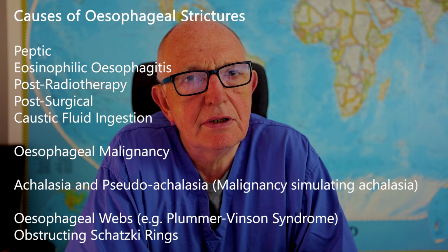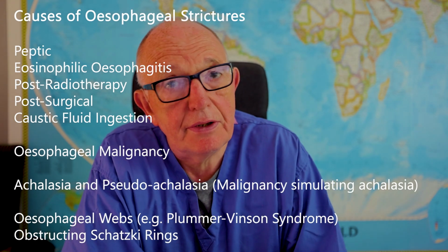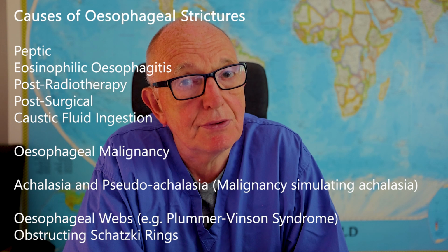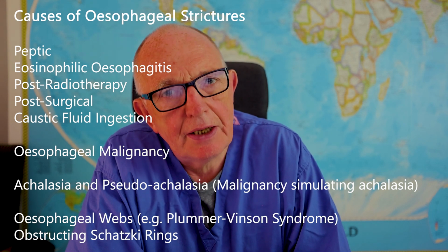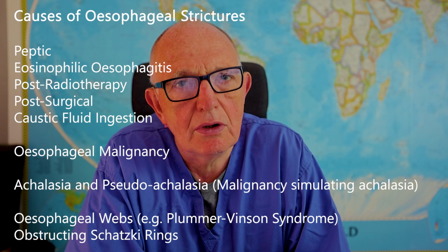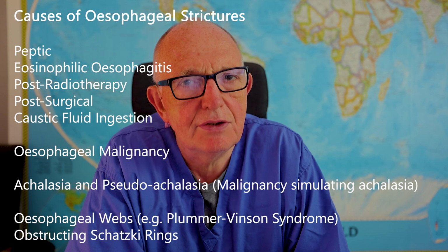Today we're going to be talking about esophageal dilatation and the reasons for doing that and the reasons for not doing that. So first of all, the commonest cause of esophageal dilatation is peptic strictures due to gastroesophageal reflux disease, but there are other causes such as eosinophilic esophagitis. You get sometimes quite difficult to manage post-radiotherapy strictures and post-surgical strictures, and the ones that can be really difficult to manage are quite long and irregular caustic ingestion strictures.